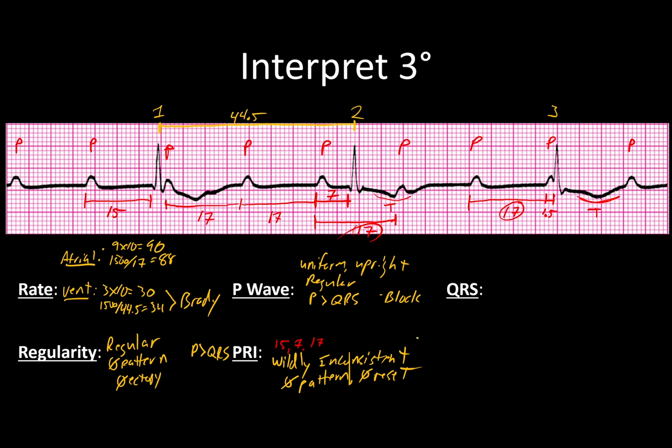That's pretty much everything we need right there to go ahead and call this third degree.